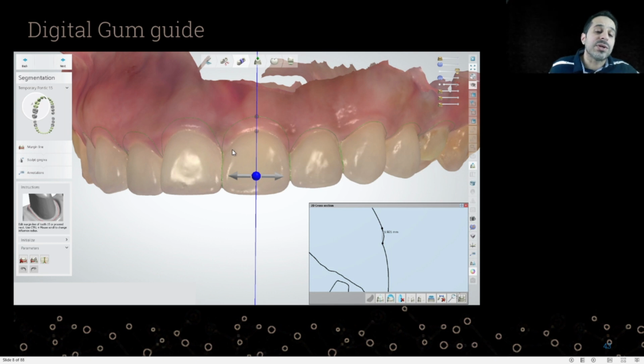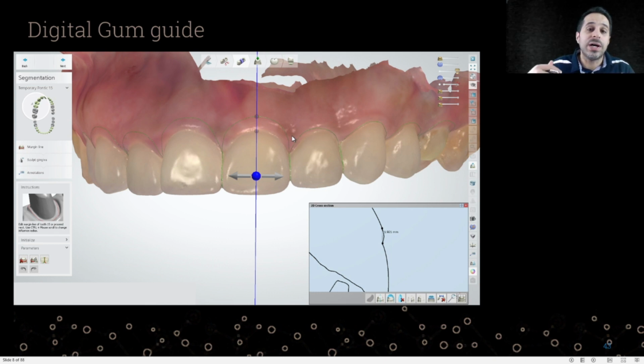But 2 millimeter, now it's time to go deeper with the information. Is 2 millimeter enough, or do we need to do a hard tissue removal like crown lengthening? That all depends on biological width. Do I need to call my patient again just to check her biological width, and how aggressive is that? You need to give her anesthesia and do probing for each tooth.